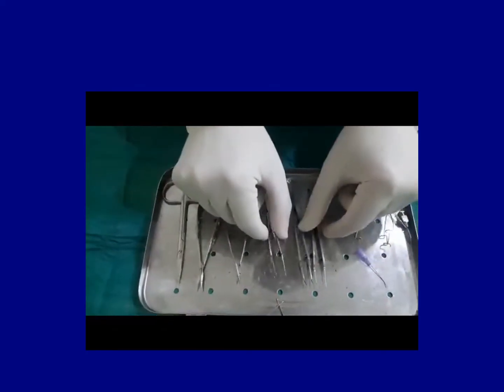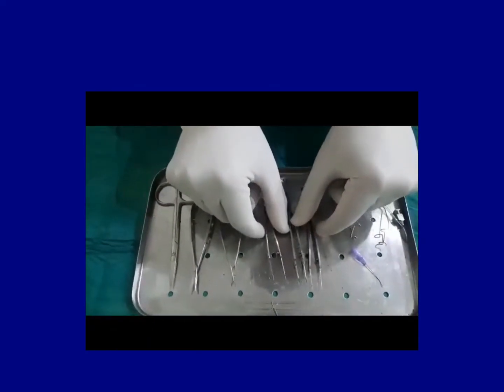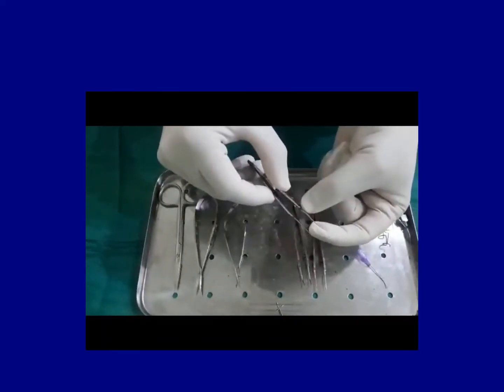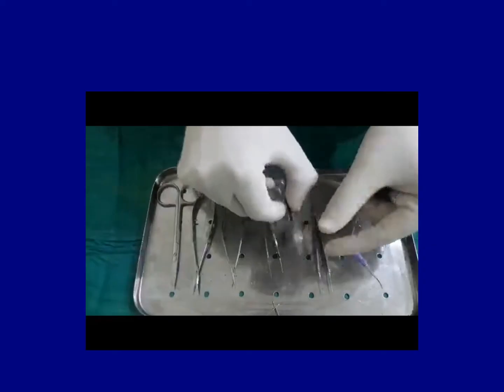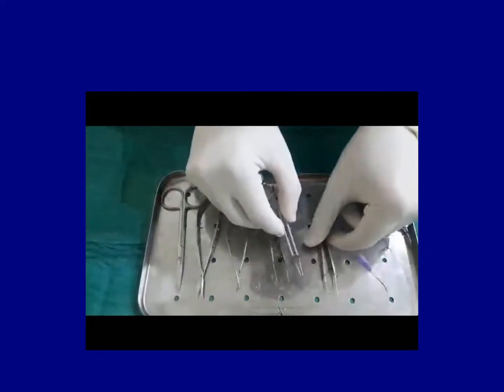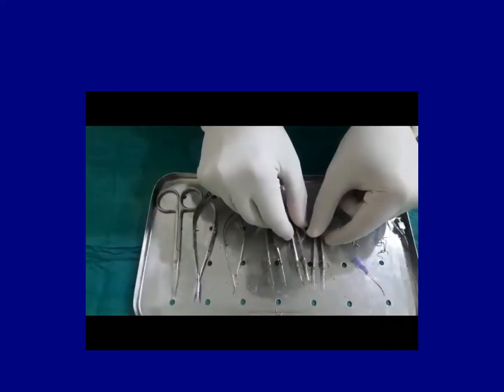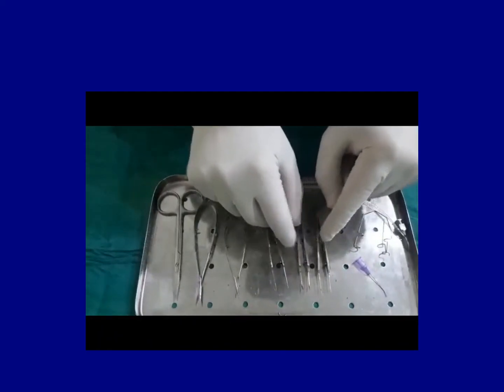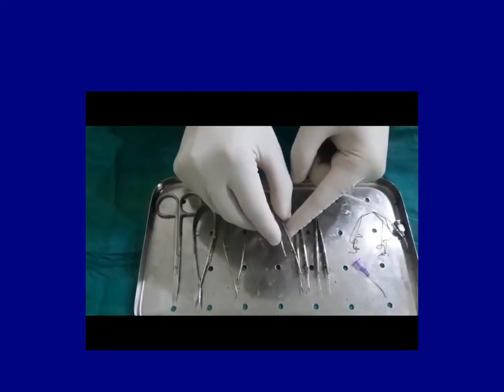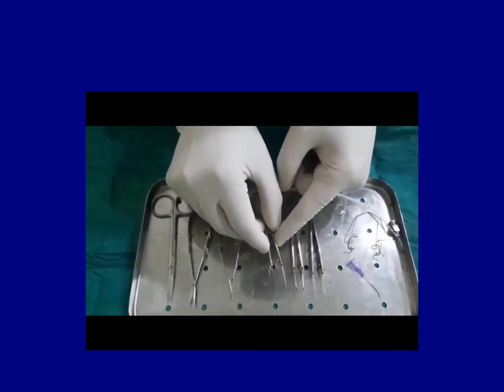These ones are the forceps. There are 3 forceps here. This one has teeth on it and it is called a tooth forceps. These 2 don't have any teeth on them, and these are called plain forceps. The plain forceps are used to insert the intraocular lens inside the eye, while the tooth one is used to hold the eye during the surgery.